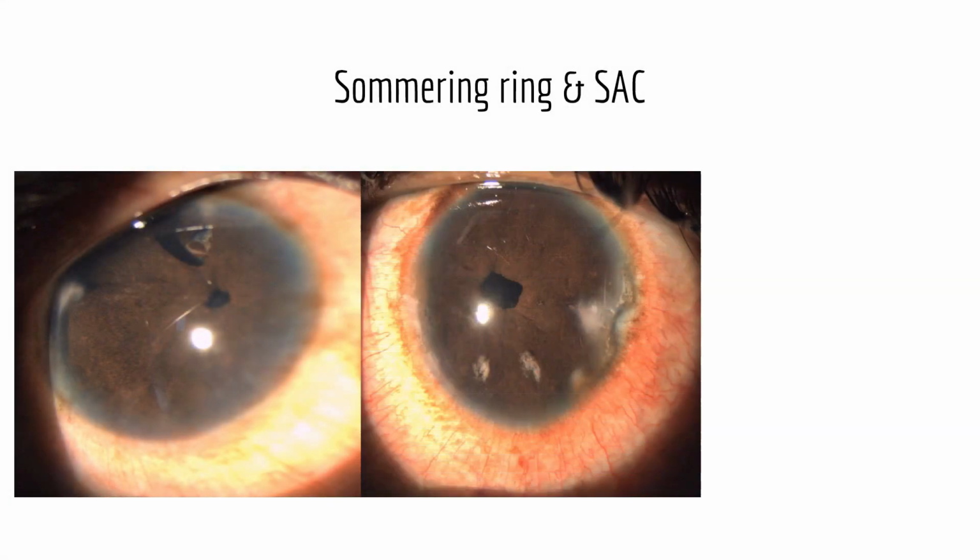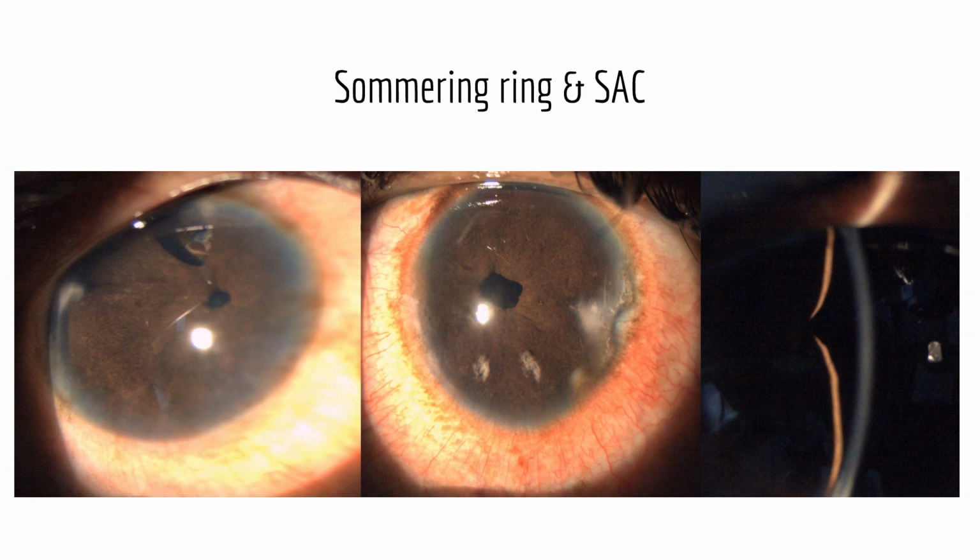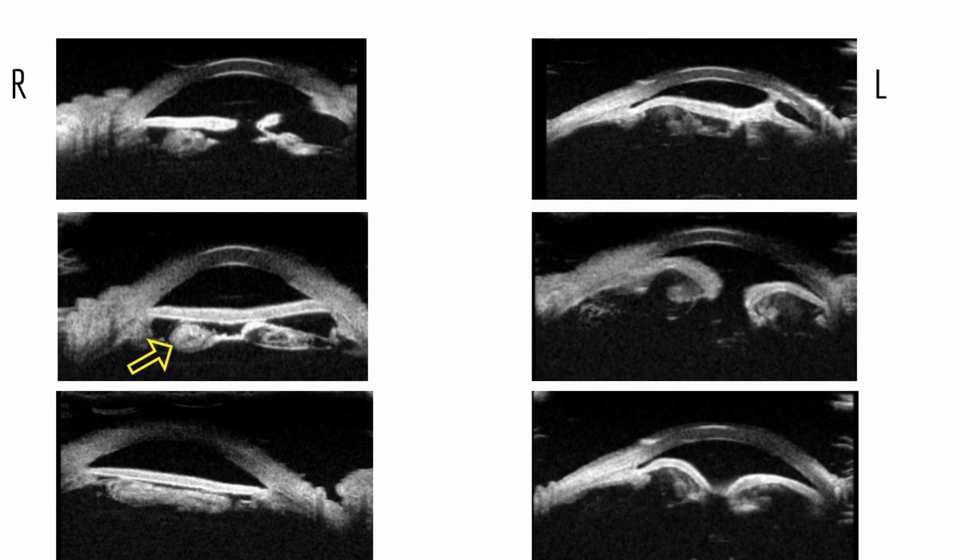Soemmerring's ring is a complication encountered frequently after congenital cataract surgery due to proliferation of lens epithelial cells. This aphakic young male was referred to rule out iris bombe. UBM showed extensive Soemmerring's ring induced secondary angle closure with high IOP more in the left eye. Laser PI has a limited role in these eyes as there is no pupillary block here. Surgical PI with Soemmerring's ring extraction can be done in refractory cases.